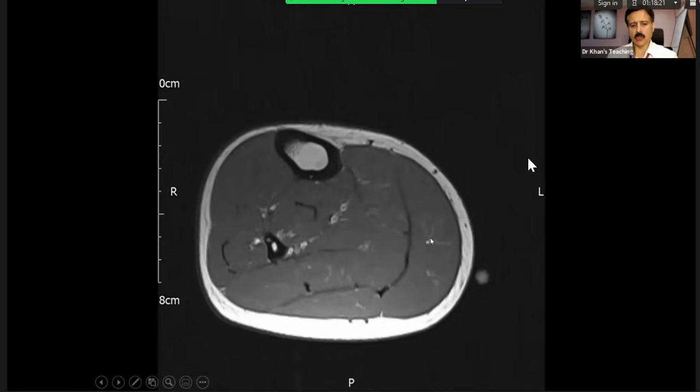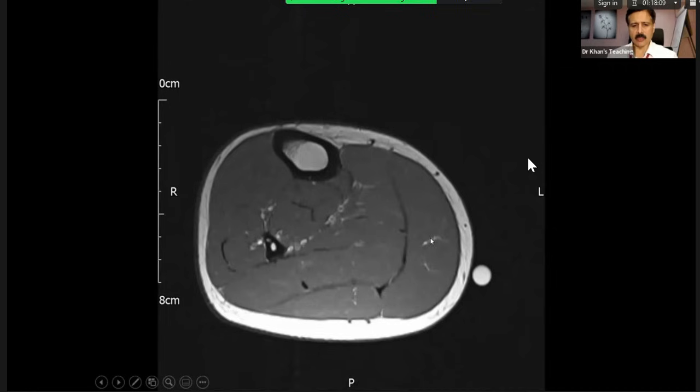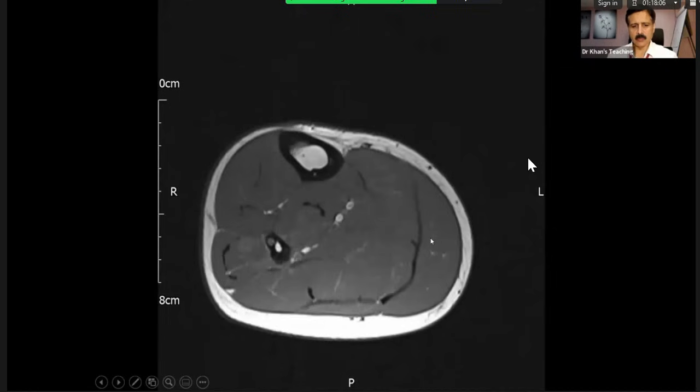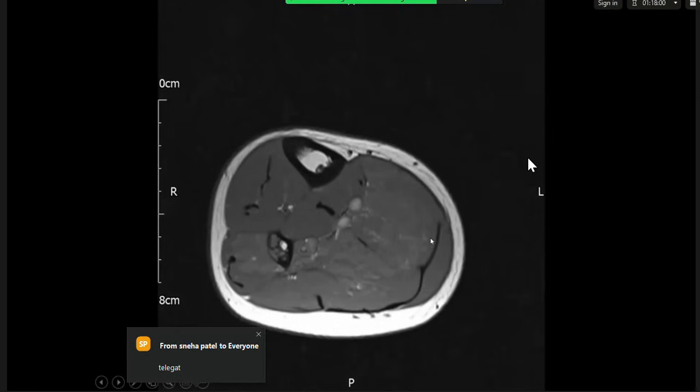What sequence is this? Can you stop here? Yeah. So the marrow is quite bright on this sequence, and the muscle is of intermediate signal. So I think it's a T1 weighted sequence. Correct. This is a T1. Please continue. So stop here, please. Can you describe your findings? So using the muscle as a reference point, there's intermediate signal involving the fibula, and external to the fibula within the soft tissue, I can see a slightly high subtle area within the local muscle. Right. Please continue.